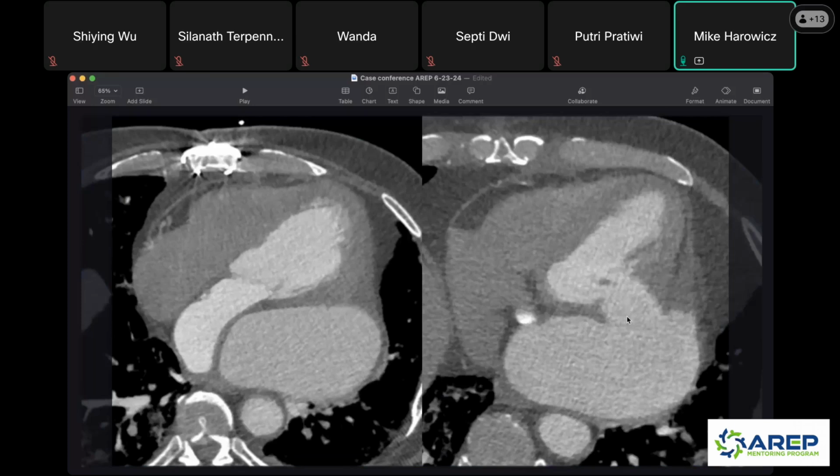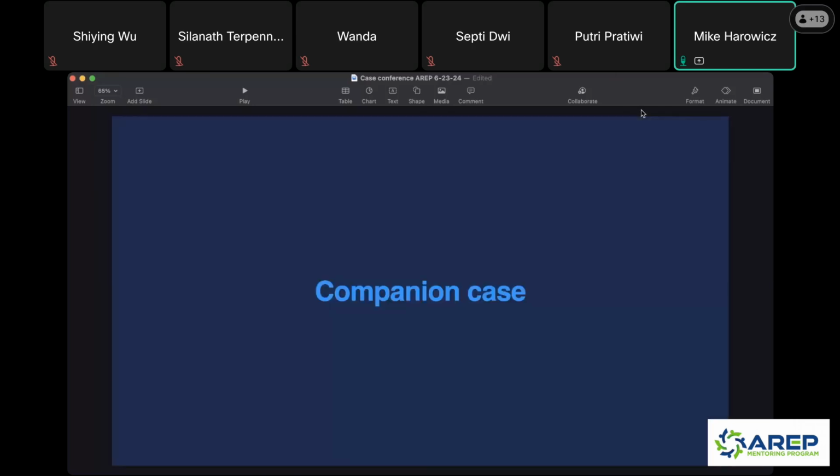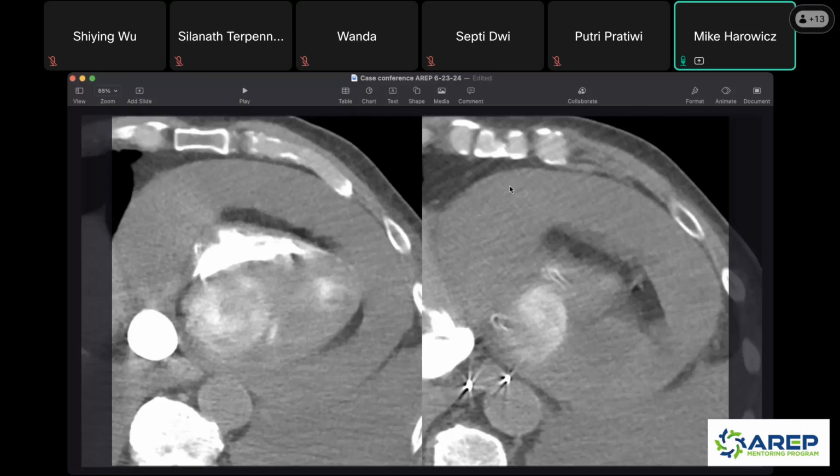So this is another patient who had a myocardial infarction maybe 4 or 6 weeks ago. They came in, I think they had some acute onset shortness of breath and chest pain. And this huge rupture, which I guess is somewhat of a contained rupture, because if this just ruptured and kept going, your whole pericardium would just be filled with blood and presumably you'd tamponade and pass. But this contained itself in some way, but it has a lot of mass effect on the heart. So this is a pretty in-your-face myocardial infarction that burst. This one I'd say is really, really difficult.